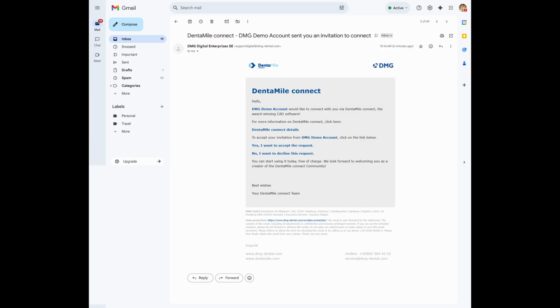On the practice side, they will receive the invitation email. The invitation email will look like this. To accept it, press the Yes, I want to accept the request button.